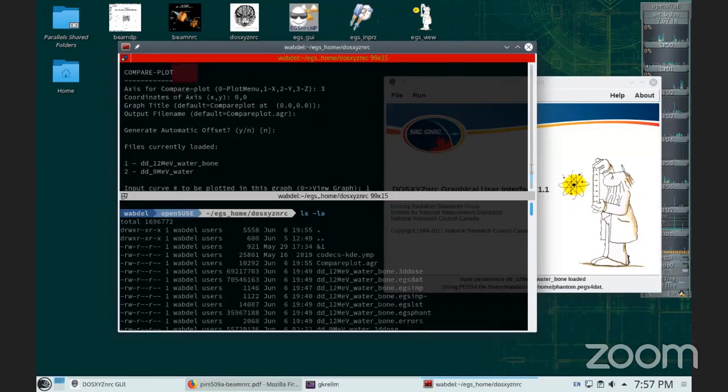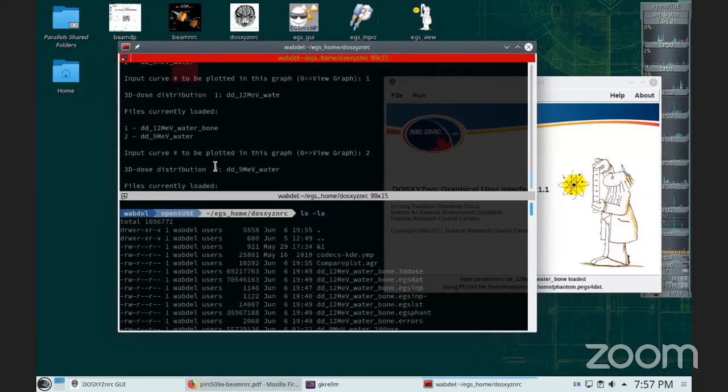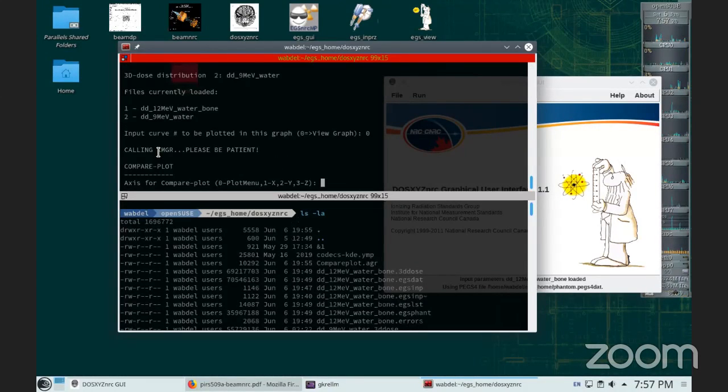And when it comes to actually showing this graph, this is not going to work on Windows. The application cannot launch Qt Grace automatically, but it will save the file. All you need to do is go to your file finder, go to the file, drag it to the shortcut of Qt Grace, and you will get your plot. Okay.